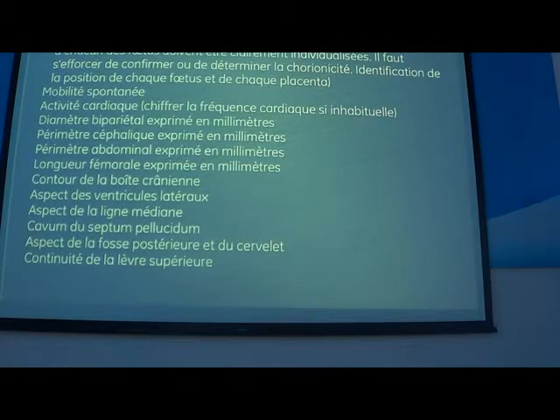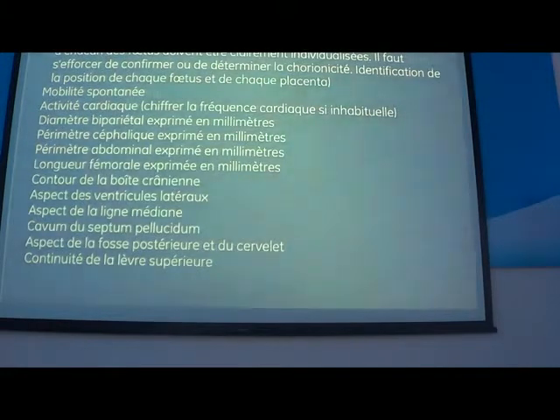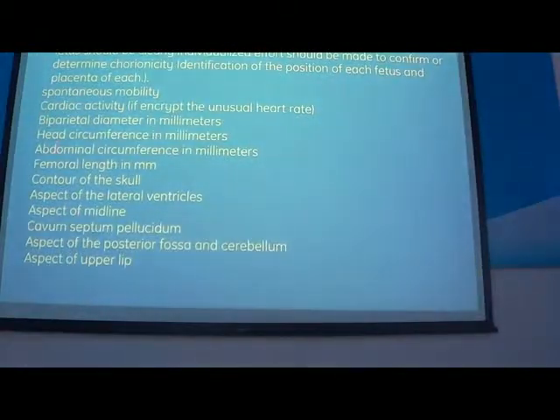And this is the guideline of what we have to do in France. So this is in French. I will put it in English. And this is a basic examination. That means the first level examination. And on the face.